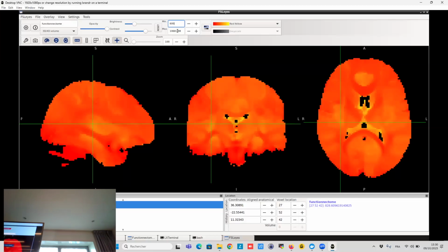Ah, yeah, the EPI signal. The EPI artifact, where you have a susceptibility artifact. This area doesn't show up in the studies. So do you have any idea? You should ask the people who are doing the scan. You can change the phase encoding.